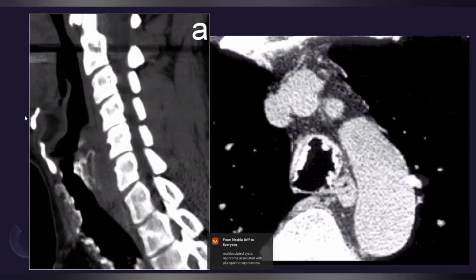These soft tissue nodules that are lining circumferentially the tracheal lumen could be papillomas, tracheal papillomas, or secondly, maybe malignant like tracheal squamous cell carcinomas. However, as these are very much enhancing and they are polypoidal in shape and projecting into the lumen, I would keep both of these in my differential.